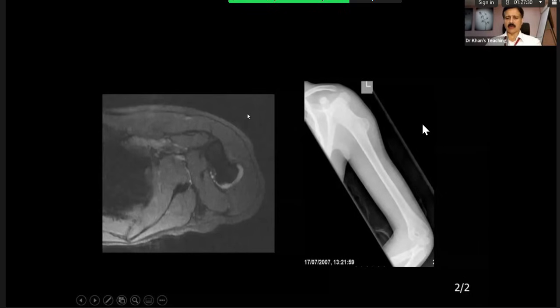there is a rate of malignant transformation. Pain is taken as a sign of malignant transformation. So pain is taken, but the counter argument is that many times, because of mechanical effect, the patient will feel this pain. So you are absolutely right, comparison with previous film, but at times it might not be very helpful. You do an MR. On MR, you measure the cartilage cap.